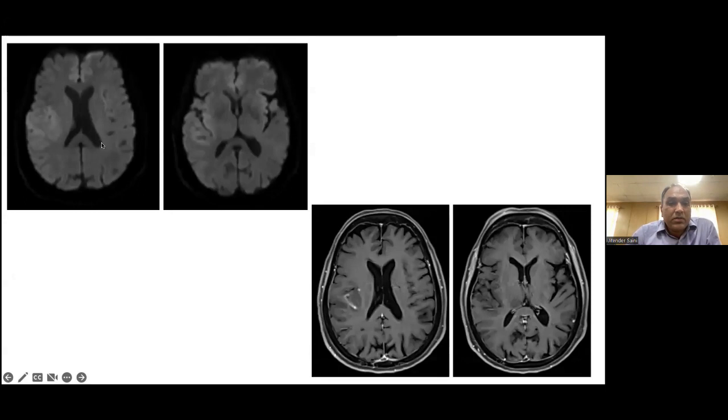It's a diffusion weighted image. These are basically T2 weighted images which have been diffusion sensitized. They measure the Brownian motion. When diffusion is less, meaning free water motion is less, this is an indirect indicator of more aggressive lesions and tends to indicate higher cellularity within the tumor. That is what is commonly perceived in cases of brain lesions. But if a necrotic portion shows diffusion restriction, it has many meanings. It can be an abscess or a hematoma in the subacute stage.